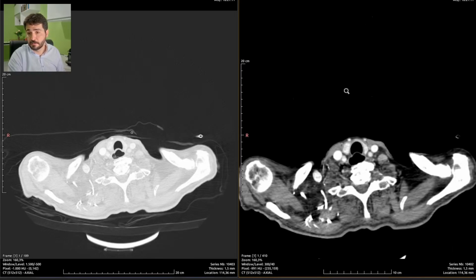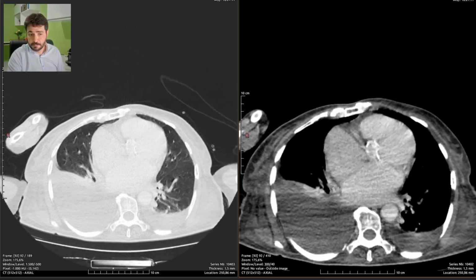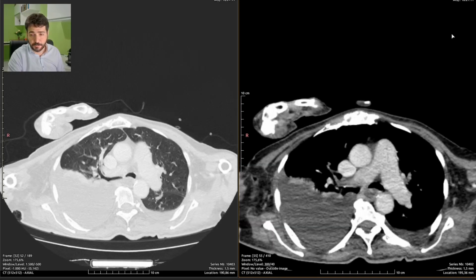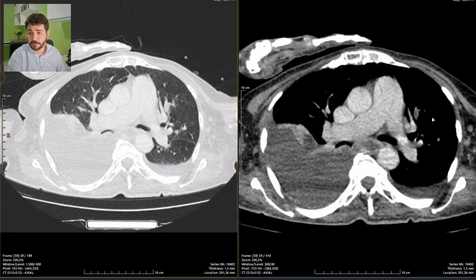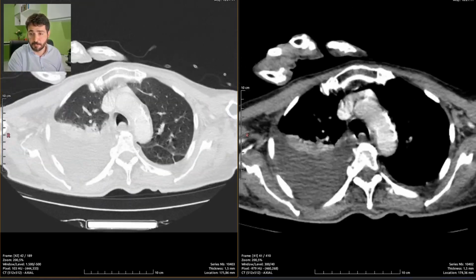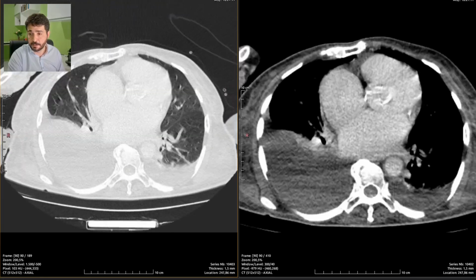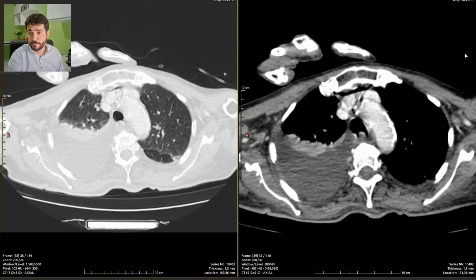So we aren't going to speak of her nails on the report, as you guys are probably screaming on your seats because I haven't spoken of the massive pleural effusion on the right and the moderate pleural effusion on the left.